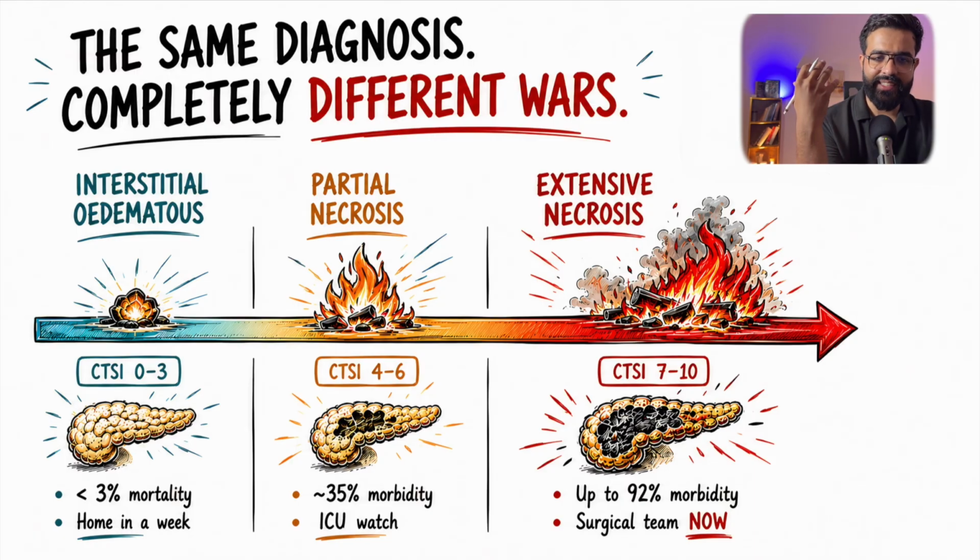Then there is the modified CTSI, which also scores the peripancreatic complications and the extrapancreatic complications. Both are valid. Both exist, and report whichever your institution or the local guidelines use. The principle is the same. Quantify the damage so the surgeon knows what they are walking into.